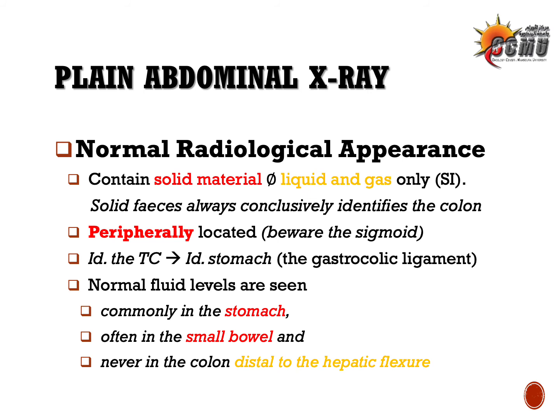Okay, so this slide shows differences between small and large bowel radiologic appearances. Actually, in the small bowel, as we've seen previously, there will be shadows of liquid or fluid and gas or air and fluid only.